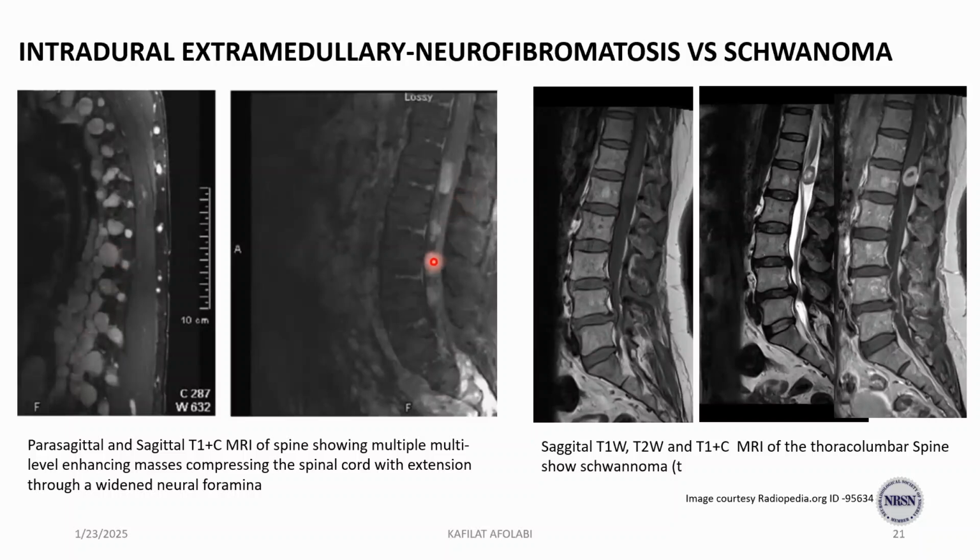In the same patient, we see again within the thecal sac this ellipsoid lesion. We see them multiple at different levels. This is a T1 weighted magnetic resonance image, and we can see this hypointensity just distal to this lesion that appears to be like a cleft of CSF, which suggests that it's actually within the intradural space.